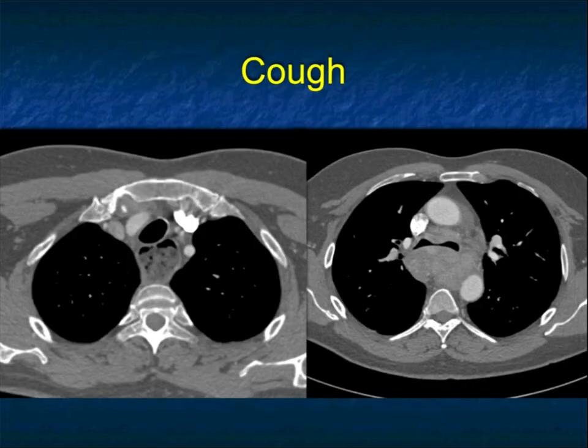Now, when you talk about posterior mediastinum and we talk about the esophagus, typically I'm thinking about things like obstruction of the esophagus due to a lower tumor, maybe really bad esophagitis in a patient who's immunosuppressed, like a bone marrow transplant patient. Maybe I'm thinking about achalasia. But what about this case? The patient has a cough, the esophagus is dilated, and I see food in the esophagus, so maybe it's obstructed.